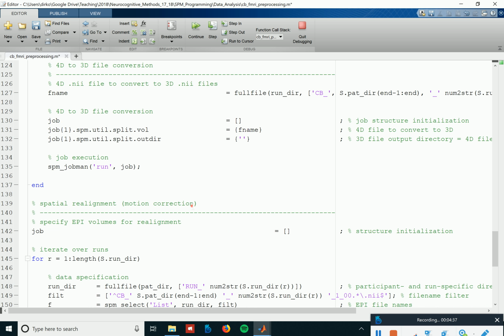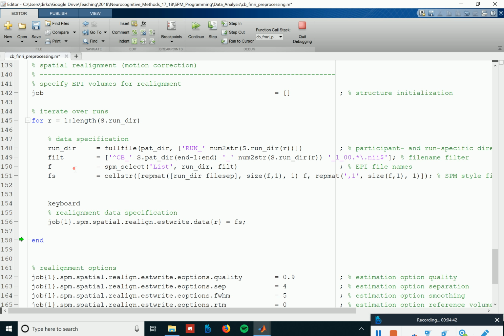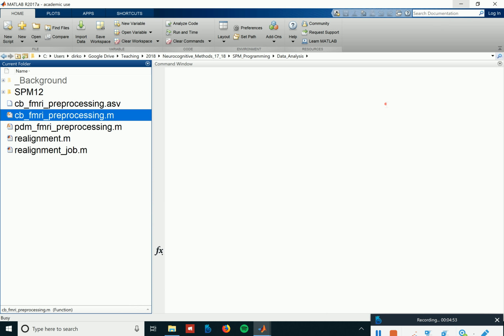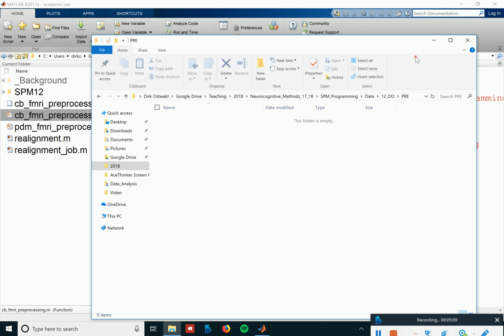So let's have a look. Like I said, this is the kind of the hardest thing in the whole thing, is to specify where which kind of data one wants to use. The other stuff is really, really simple. Now we're running the thing again, and wait a little bit. This is maybe due to the fact that somehow the stuff is wrong, or I'm actually in there.